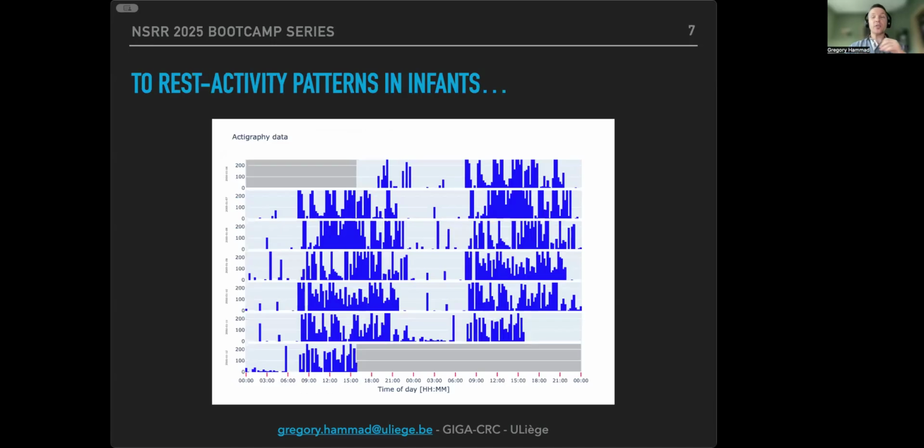There is also something else that I do like, and that's more specific to actigraphy than just sleep, like rest at night. Since you have the whole pattern of activity, you can track this kind of rest-activity pattern, and the timing of the two is important. Then you can create double plots. Here it is nice to see that 2 consecutive days are plotted on the same line. In between, you see a period of activity, then a period of inactivity, and then activity again.